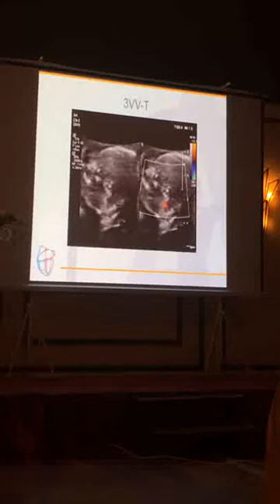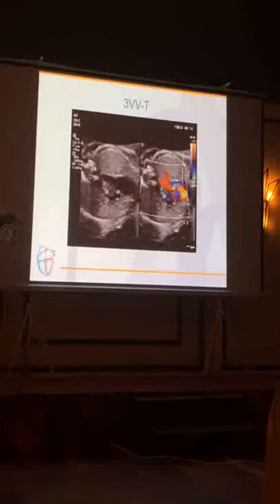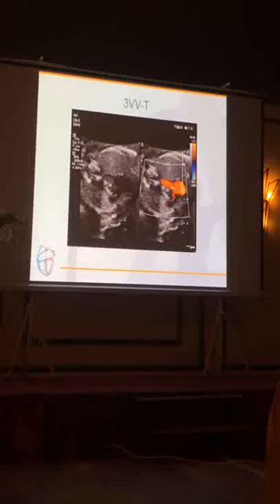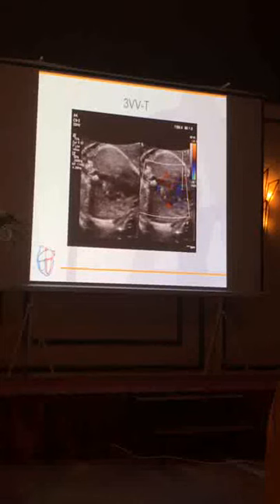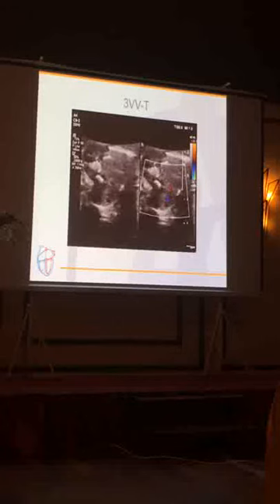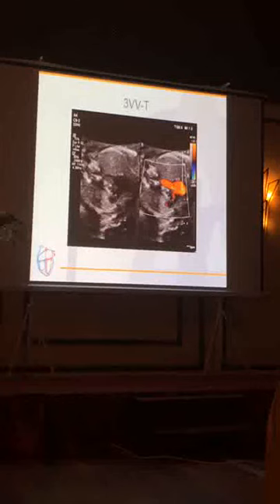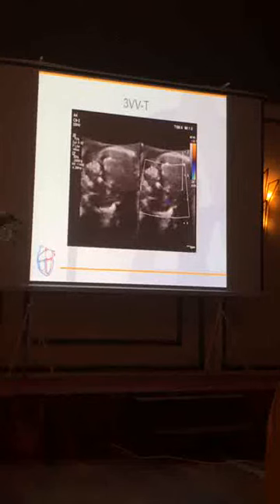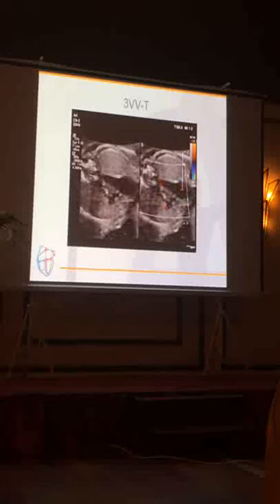Now, a couple of cases I really want to discuss with you. And this is the first case. Sorry for this computer being very, very slow. And from now on, I would like it to be a bit interactive, so maybe someone would help me, and ask the audience if they like this view. And if they don't like this view, then what is wrong? And I give you maybe 20 seconds, and later I will tell you everything. So take your time. So, who says it's okay?